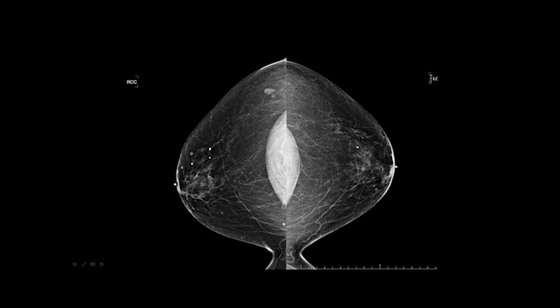So here's some CCs, as you could see on the images. And here, once again, they're going to draw a line all the way across. And the right CC, it's not perfectly centered. It's not bad, but it's not absolutely perfect. So it's pointing medial, which means it's missing retro medial area posteriorly.